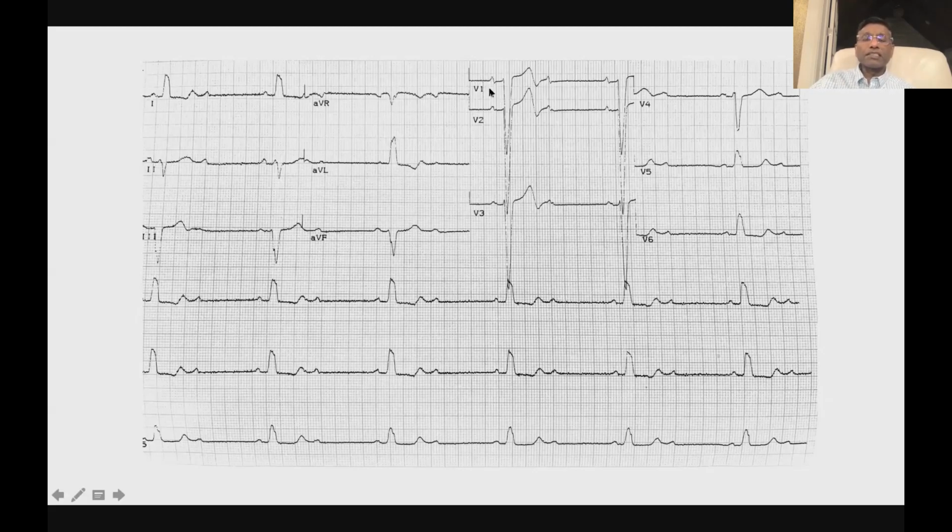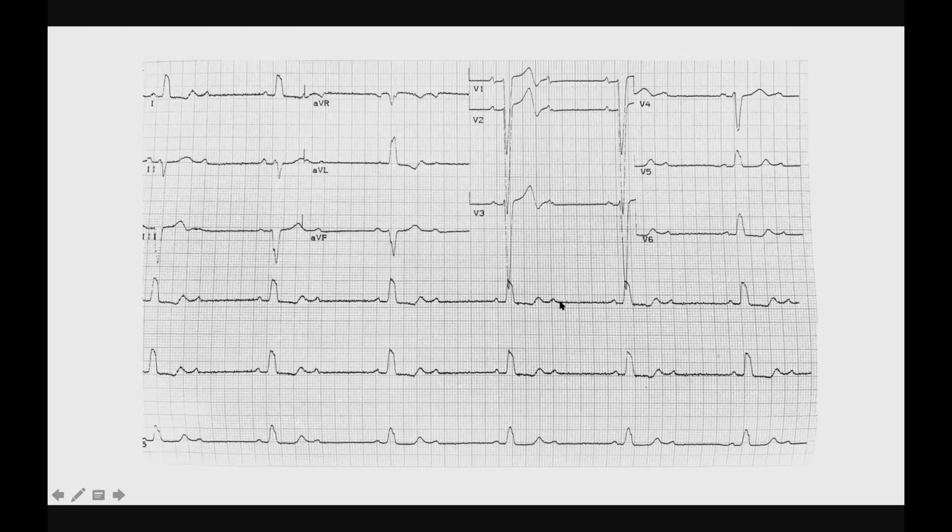So I'd agree there's a sinus mechanism, a P wave. And I think you call this little hump out here after the T wave a U wave, and that is where a U wave would be. I'd agree with that. It's a little more of a separation between T and U than we would normally see. You can see here there's a pretty solid isoelectric line. It's a little uncommon for it to be that long, and so maybe not a U wave.